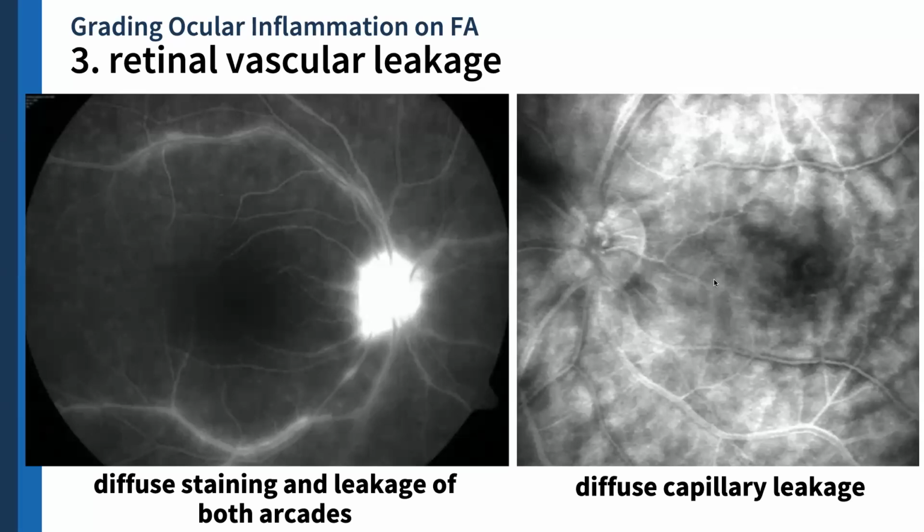The other resident, do you agree? Sige. Who votes arcades? So mag-isa ka lang. The rest of you think capillary inflammation represents a higher level of inflammation? Not sure. Okay, the correct answer is capillaries.